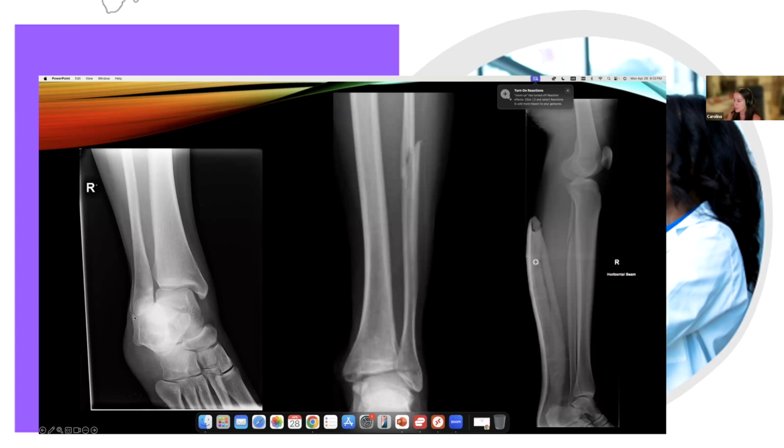However, we're not seeing any particular fracture. And this is where we cannot just say, well, probably it was nothing or just a dislocation and that's it. We need to assess the more proximal bones, because the tibia and fibula tend to form somewhat like a ring structure. So if you think of a lifesaver and I ask you to break it, you are going to break it at least in two parts. It's very hard to just do it in one.